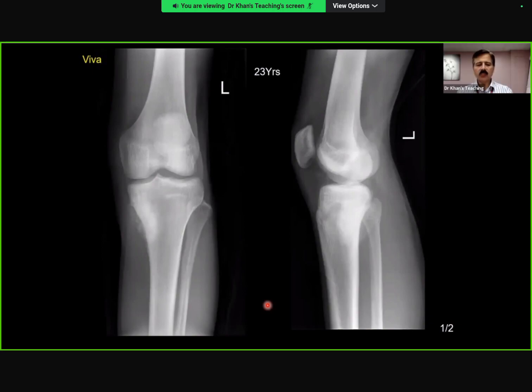Yeah, so this is critical here in this particular case. There is a black and white, what we call bony matrix, which is osseous matrix. And here, the examiner is going to check your thinking. You can see the osseous matrix has also gone into the soft tissue. You can see all of this sclerosis. So because of that, you have to be more confident and emphatic that this is in keeping with an osteosarcoma.